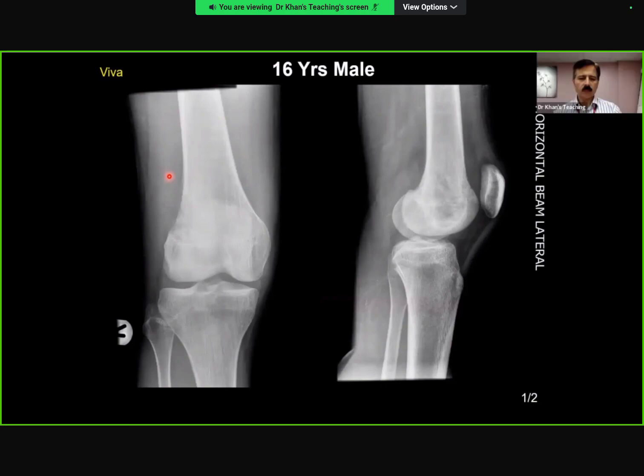Yeah. The appearances overall are aggressive, and in this location, the distal femur, my differential is between, most likely a Ewing sarcoma in this age group location with a large soft tissue component, but an osteosarcoma is also a possibility. Right. So, eccentric metaphyseal, what comes to your mind, number one, out of Ewing's and osteo? You remember the diagram, my favorite diagram? Yeah, so that's more osteosarcoma.